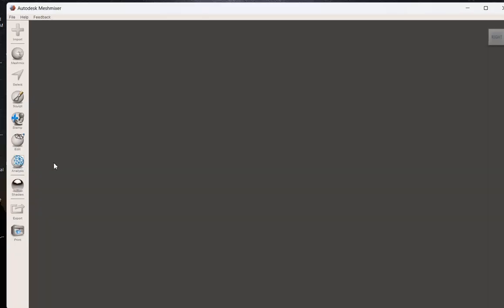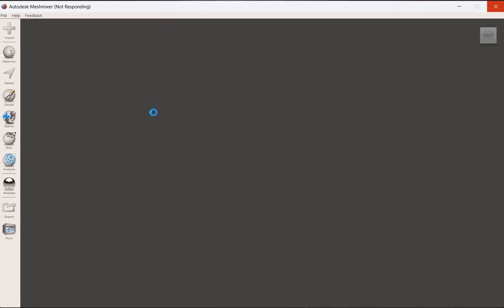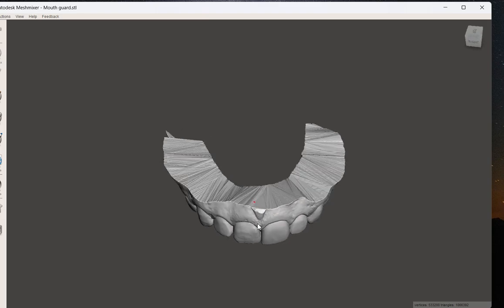So we went ahead and we saved it here. And we'll pull it up. And here it is.